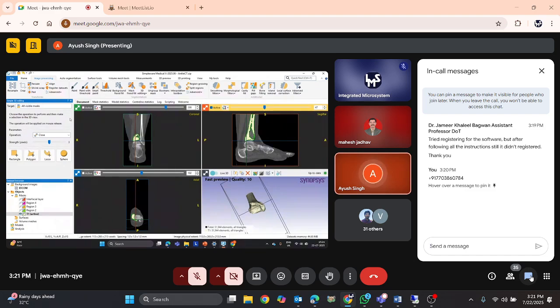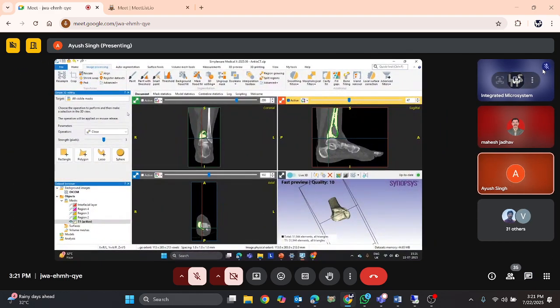Why? We will cover that in upcoming sessions, why soft tissues play a crucial role while segmenting and why it is the most difficult part. Just to give a brief, whenever we are segmenting any soft tissue, it also highlights the small errors present in the dataset. It also highlights any metal artifacts or other artifacts that are present. It also gets overlapped with the orthopedic dataset, that is bone parts or any muscular region that is present. So it's generally difficult to identify the region. But we have a smart workflow for that too, to segment out different regions.